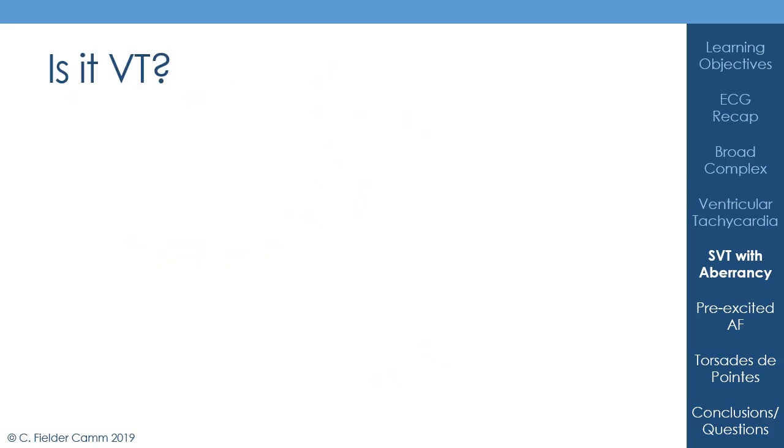So I've talked about some of the minutiae of ventricular tachycardia, which I think are interesting. But I think if it's the middle of the night and you're an F1 on a night shift and you get called to see somebody, your real question is: is this VT, or at least should I treat it as VT? And so this is the flowchart that I would recommend.